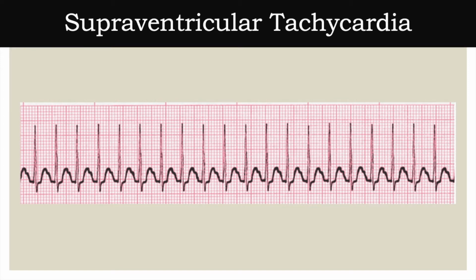All right. So my favorite one is the supraventricular tachycardia. So this one is crazy. The patient is obviously going to have poor cardiac output because the heart is just pumping, and there's no tissue perfusion because it's just going crazy. So usually for supraventricular tachycardia, it's above 150.